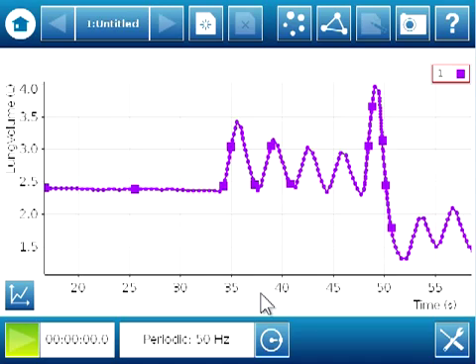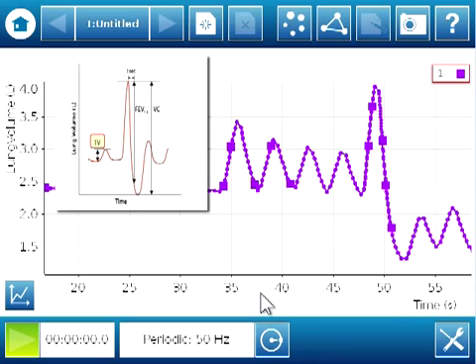When I began breathing through the mouthpiece, I took 4 normal breaths, trying to inhale and exhale as I normally would. Following these 4 normal breaths, you can see a more dramatic change in lung volume. We'll analyze that in a little while. Let's first analyze the normal breaths. From this data, we can obtain a value called tidal volume. This is the amount of air moved into and out of the lungs when breathing normally.